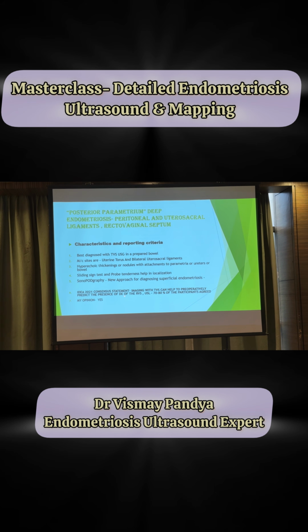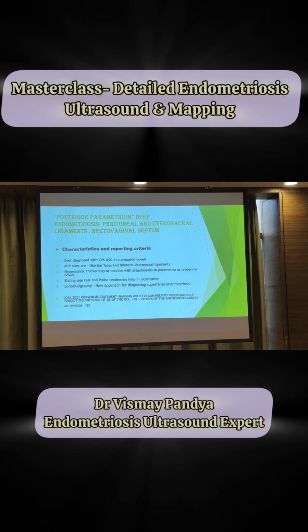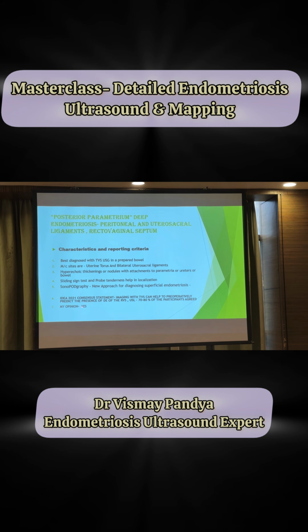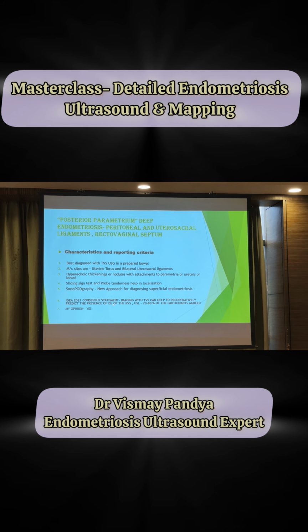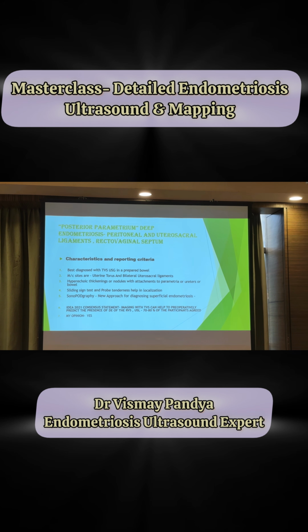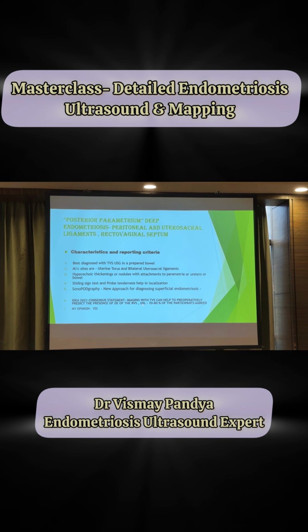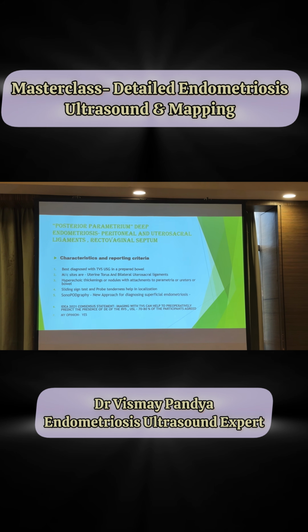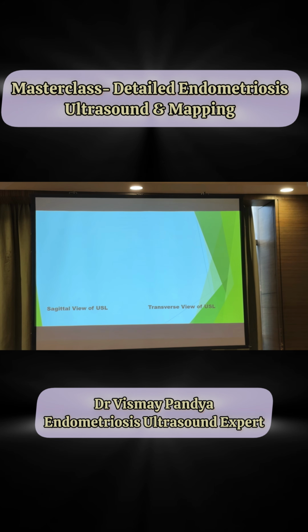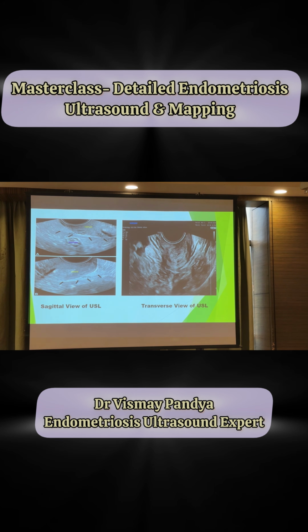Okay, so this is the IDEA consensus statement. They hired like 200, 300 gynecologists to do the sonography, and there is an opinion: yes, TVS is very good for predicting involvement of the posterior parametrium. So there is no need of doing an MRI. With good training, 70 to 80% of participants have agreed on that, and I too agree on that. So this is how the USL looks on a sagittal and a transverse view.